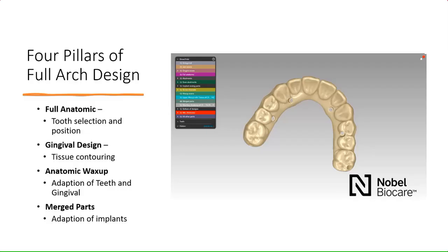So I'll be going through some basic designs today. But those of you that are new to full arch designing might pick up a couple pearls here and there. I'm going to make some assumptions because this is an advanced group.